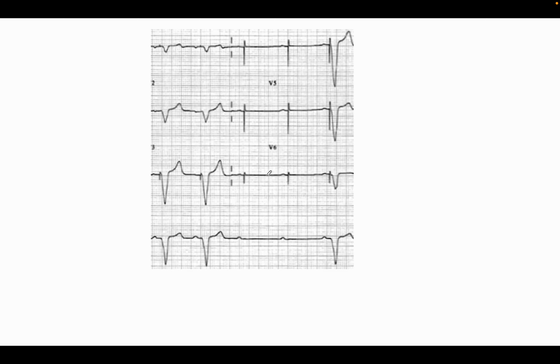Well, actually what's happening is that the pacemaker has failed to capture the heart. So we call this a failure to capture. And what capture essentially means in the land of pacemakers is when the pacing lead is able to successfully produce a beat. It provides enough energy down the lead to essentially stimulate the myocardium and get it up to threshold and produce an action potential.